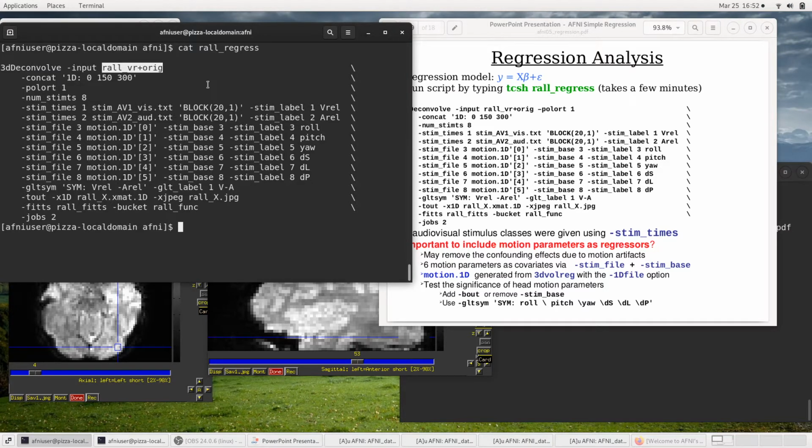Just to really save space on the handout, unfortunately, we've just put this into one data set instead of 3. So we might want to make a note of what pre-processing has actually happened on this data set. Has it been t-shifted? Has it been registered? Has it been blurred, scaled? All these possible pre-processing options. Remember, this course is just a simple example, so we didn't do everything to it.